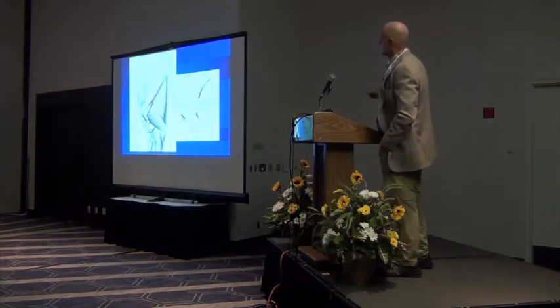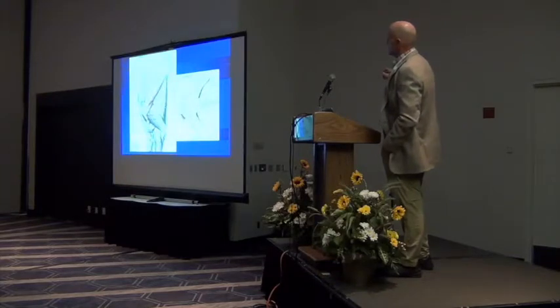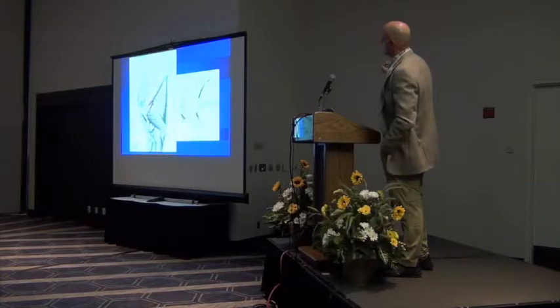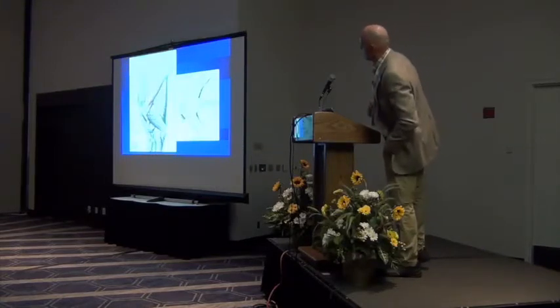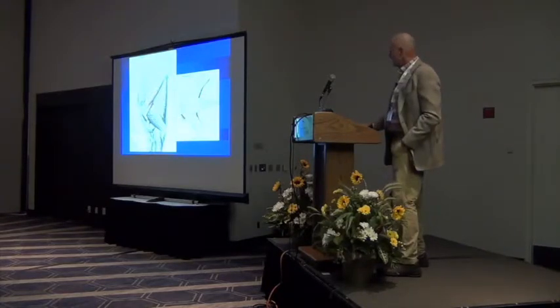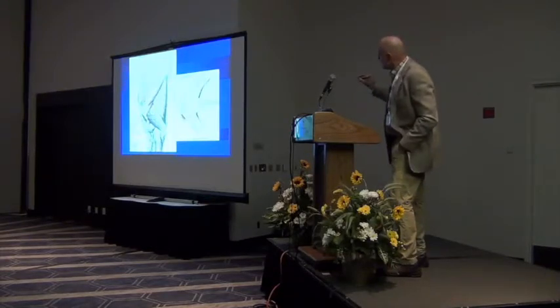And this is just kind of showing you joint capsule, biceps bursa, and all the muscle mass around it. The triceps, the deltoideus, infraspinatus, supraspinatus, and then the brachiocephalicus would be on top of all that. So as we go through and we look at these things, and I think I showed the infraspinatus coming across right here.